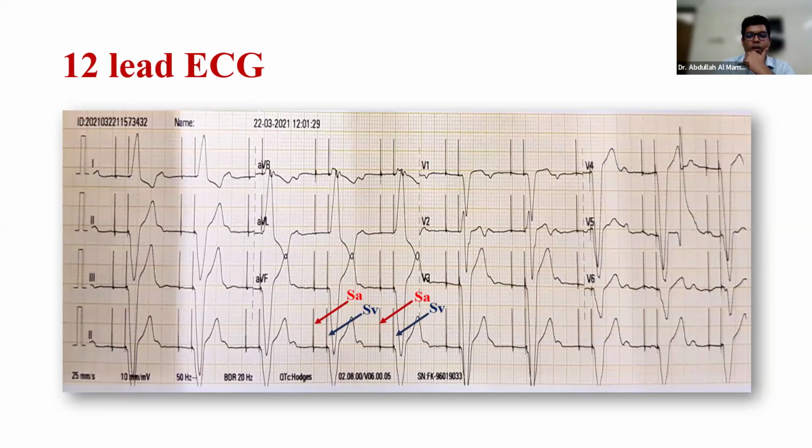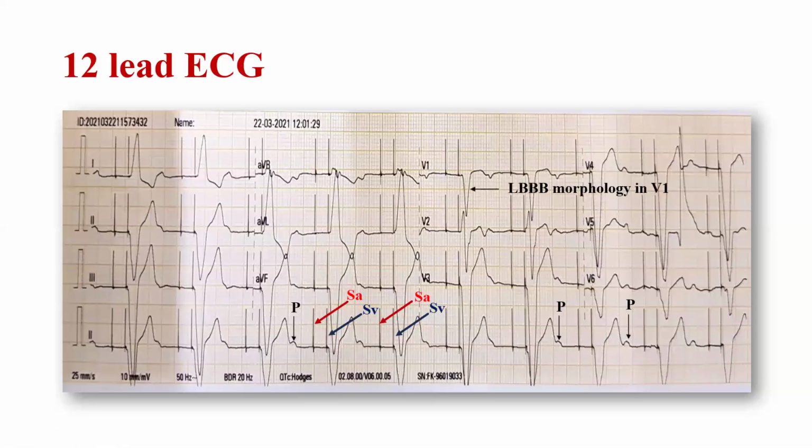Look at the atrial spike. There is an atrial spike, but there is no P wave after it. Rather, the P wave is present before the spike; here, I mark the P wave. The morphology regarding ventricular pacing is LBBB morphology, so there is RV pacing.